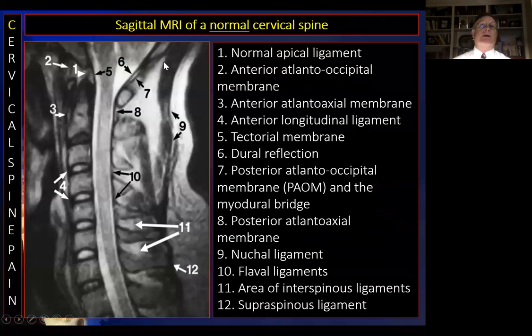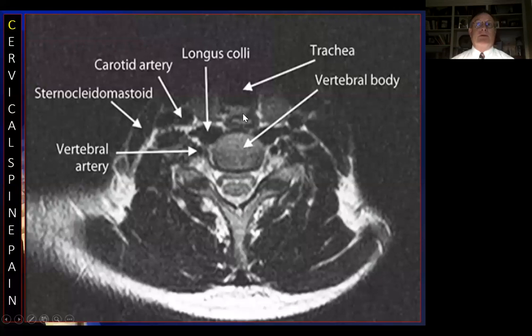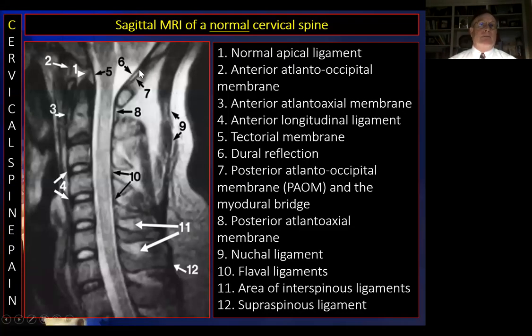Now, here's the kind of pop test we'll sometimes give when we're doing depositions, because these so-called experts come in, they're going to talk about these MRIs that are normal, and they're missing complete tears of large and very important ligament structures. And again, not to talk pejoratively about anyone. You don't make your candle any brighter by blowing out your fellow competitor's candle. But this is what we do, and we know what normal anatomy is, and folks that don't are going to look at this image all day long and never see this anatomy.